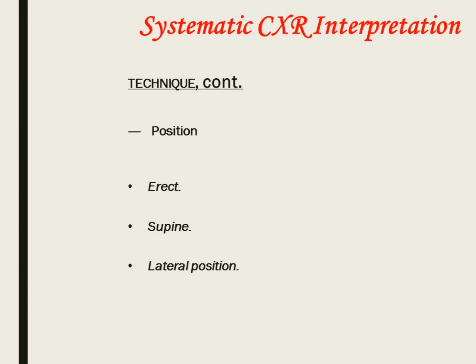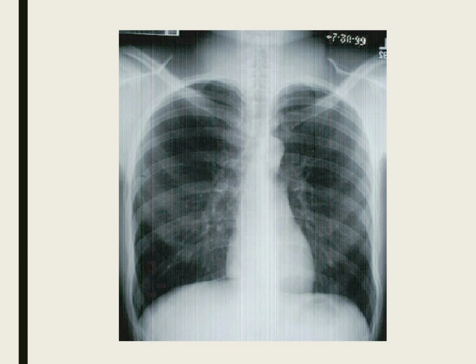Lateral position, obviously, we don't do it as often. We're probably doing it right now here in ICU, sometimes looking at pleural effusions, sometimes maybe pneumothorax, but you know, it's something that we do very rarely. So that's your X-ray, right? So what do we have on this X-ray?